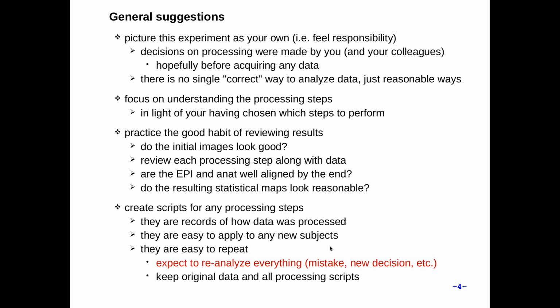So anyway, you might make a choice like this later on, and you want to be able to just start over. Maybe you'll decide that you need a new cost function for registration to do a better job for some reason based on your data.